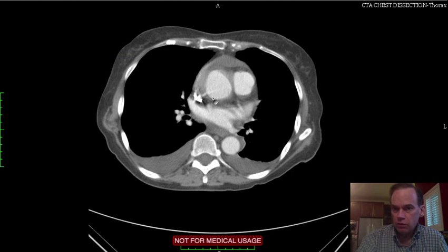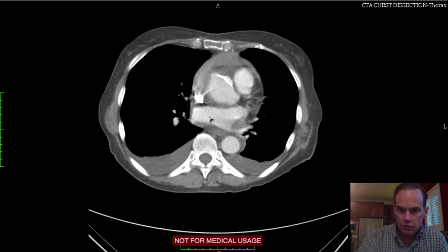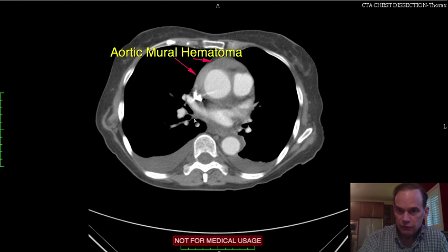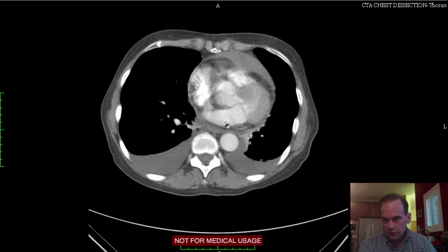What do we have here? We've got vessels coming from the left and vessels coming from the right, coming from the lungs on the left and right, and joining to create this area, which obviously contains contrast opacified blood, and this is the left atrium. So those are pulmonary veins emptying into the left atrium, which of course in turn has to empty into the left ventricle, and you can see that a little here.